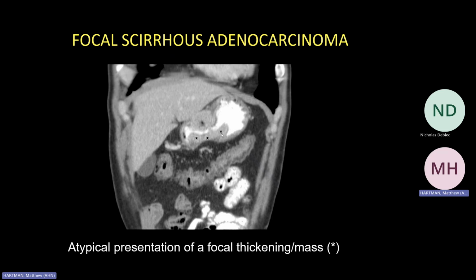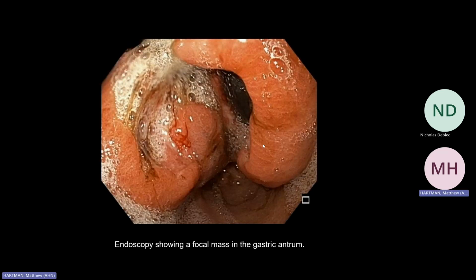Again, the important thing is making the finding, describing that finding, again, using one of those 6 pattern words will help you make the findings and then come up with a differential. And here is the endoscopic view, focal mass going into the lumen.